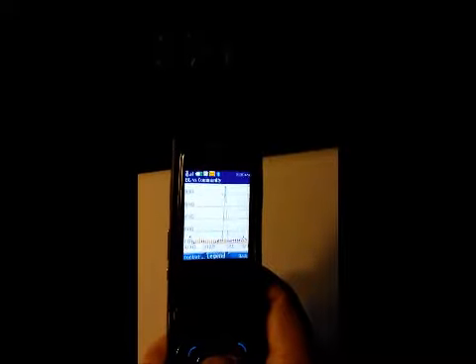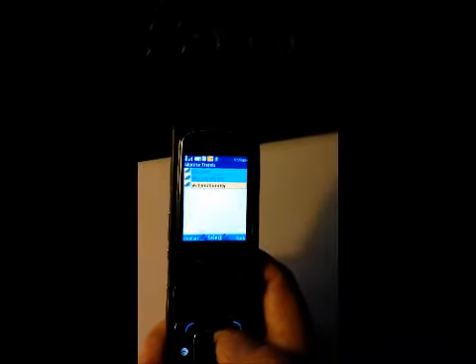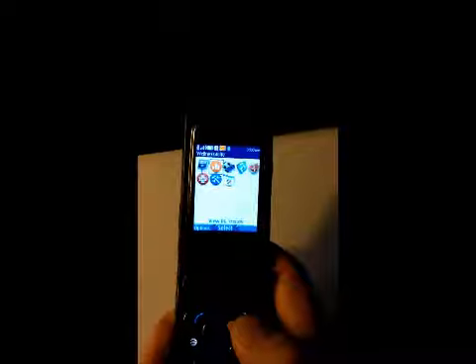So that sort of gives you an idea of the various types of patterns, and you can take a look at the community and how we're doing versus the community. I will see how I'm doing relative to my community, shown here in just a moment. And let's see. There we go, right there. It looks like at one point over the last period, we had a huge spike. The orange right there is the rest of the community. That was just probably an odd data point that we entered in as well. So that sort of gives you an idea of the various types of functions that can be done using the mobile app on many different phones.